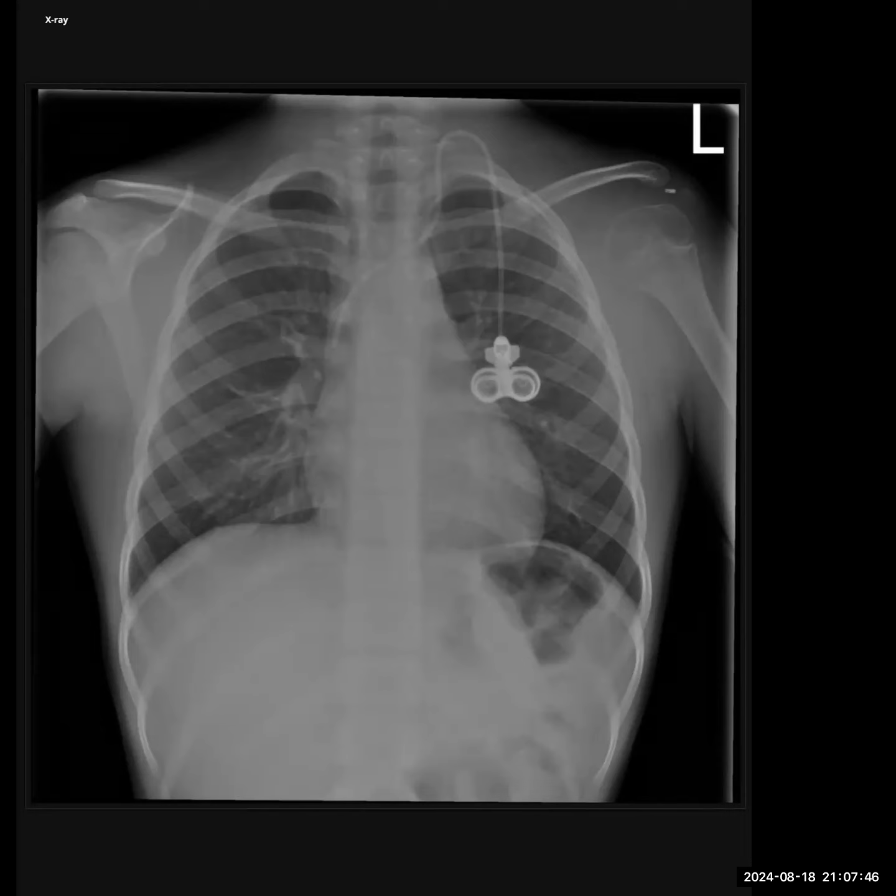I'm trying to look at the bones. Bilateral clavicles appear normal. The right shoulder and humerus appear normal. On the left side, I can't see the scapular outline well defined, and there is a large area of soft tissue in place of it. I've been thinking whether this is a post-operative patient or agenesis of the scapula. I would correlate with the history of this patient and any previous images available from childhood.